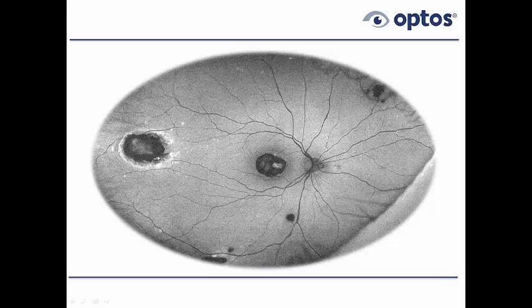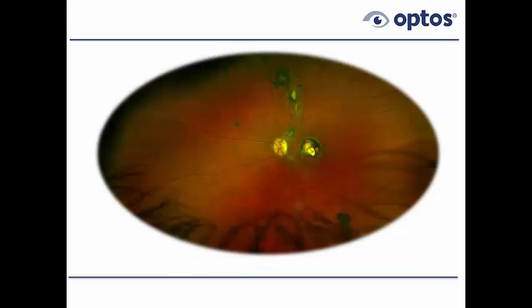So this is really reactivation of congenital lesions, and it can happen two to three decades afterwards. The organism Toxoplasma gondii can actually live encapsulated within the retinal nerve fiber layer for decades, which is sort of surprising. And then sometimes it gets triggered by stress or a problem with the immune system, like for example patients that develop AIDS, if they had toxo earlier in life, the toxo lesions can become active. Here's his left eye.